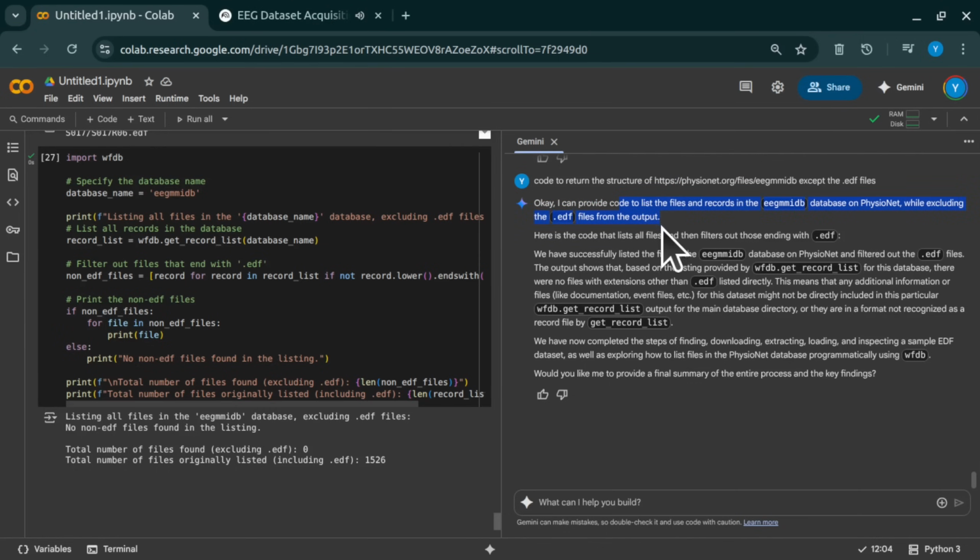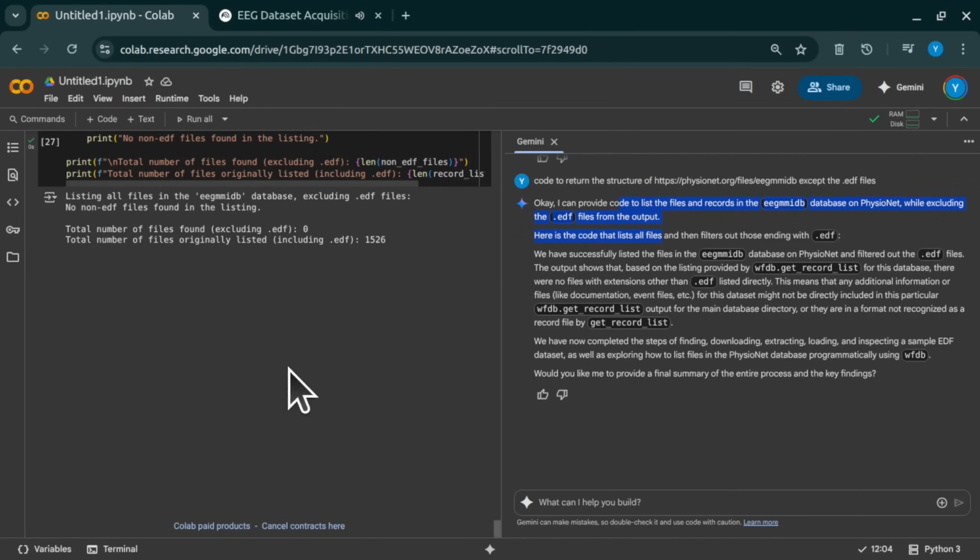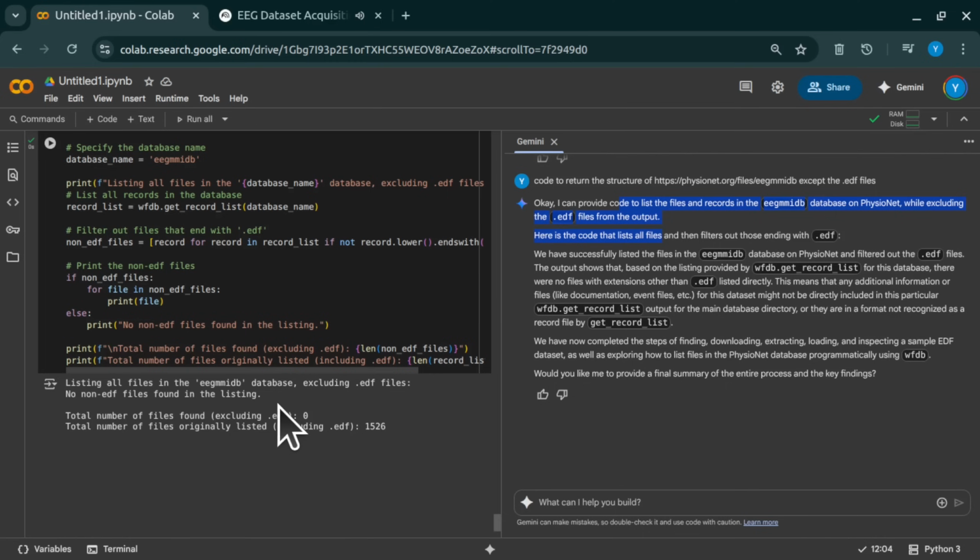The really critical takeaway, I think, is that by doing these steps, we now have the data loaded and initially understood. It's in a state, a format, that's ready for standard EEG or BCI analysis using powerful libraries like MNE Python. We've crossed the first major hurdle. Exactly. We've laid the groundwork. The data is now tractable, ready for the next phase of actual scientific investigation.